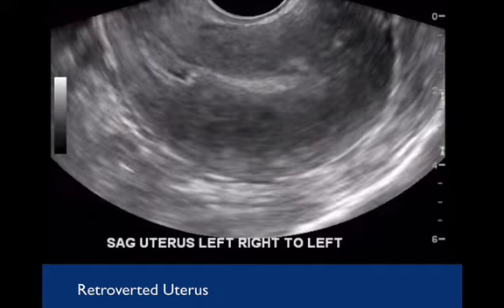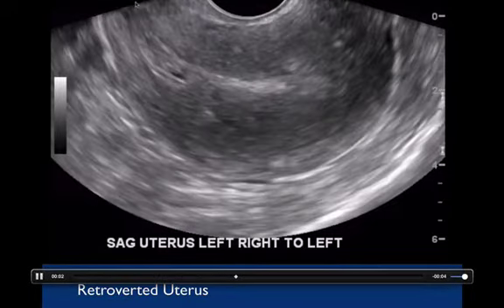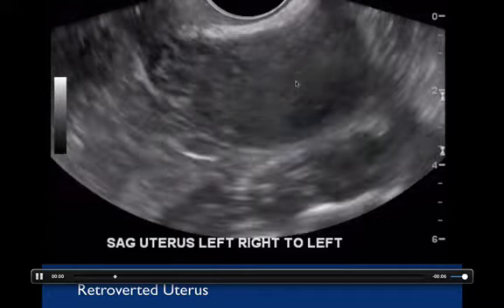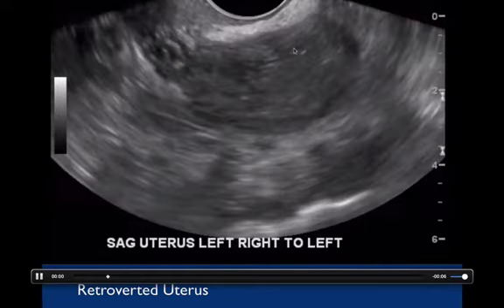This is an example of a sagittal view of a retroverted uterus. So now we see the cervix anterior and the uterine stripe coming posterior, and so we know that this uterus is tilted backwards, or it's a retroverted uterus.